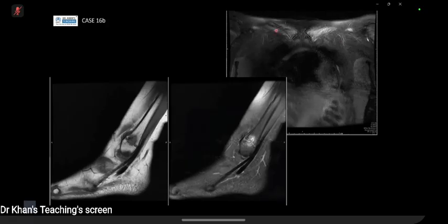There's MRI here now proving that on the right side you've got abnormal marrow edema. You can't appreciate the periosteal reaction as well, but maybe there's this elevation here, and also on the left side, so bilateral clavicular involvement, and in your tibia and fibula, because you've got your peroneal tendons running along here. It's the metaphyseal region, without the clavicles you think, is this infection? But putting 2 and 2 together, you rightly got it as a CRMO.